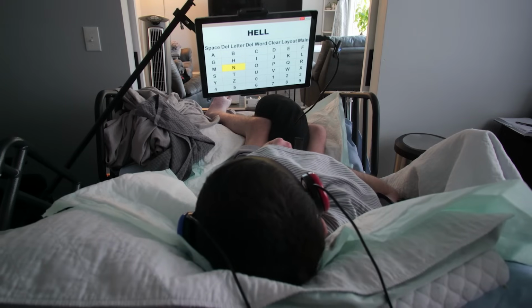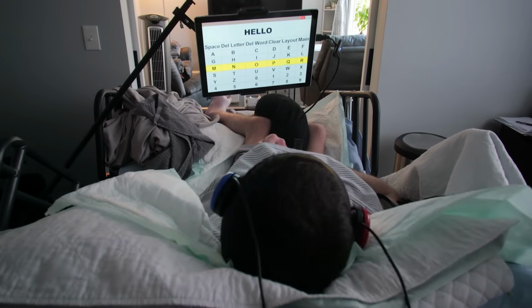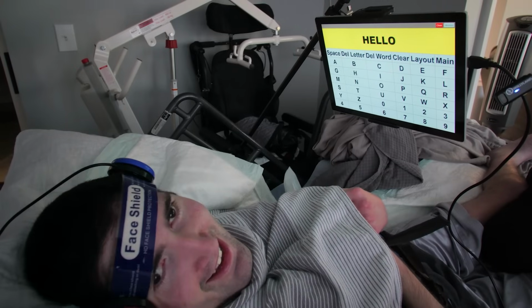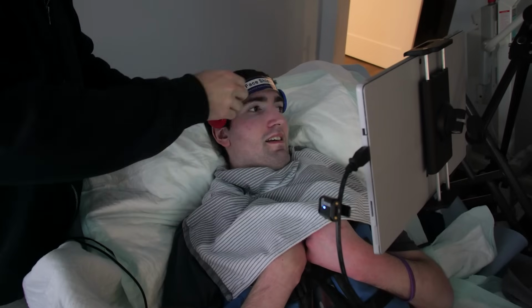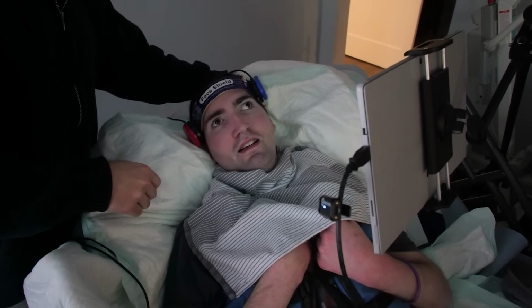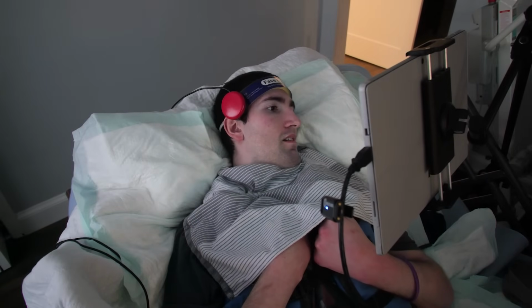This video is going to be a part 2 video to my previous video about Ben's communication software. Just quickly, even though the previous video did this already, I'm going to do a little bit of an overview about Ben and his condition. The previous video is a little more in depth, so if you want to check that out, go check it out. But in this video, I'm going to be going over mostly the software and the updates to the software.